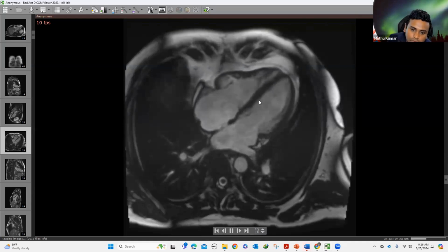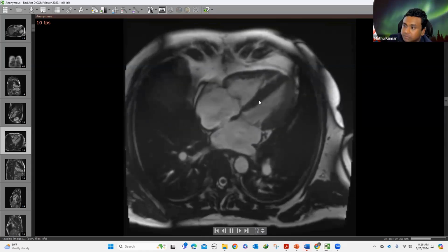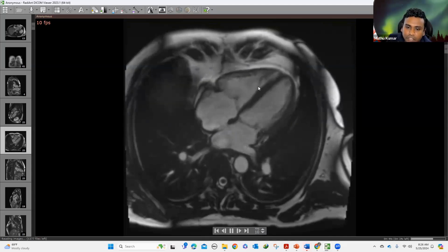So for the diagnosis, not only do you mention in the CT report that the right atrium and right ventricle are enlarged, but you also have to mention that the septum is buckled towards the left. Then the patient gets a referral to cardiology. So evidence of RV strain.